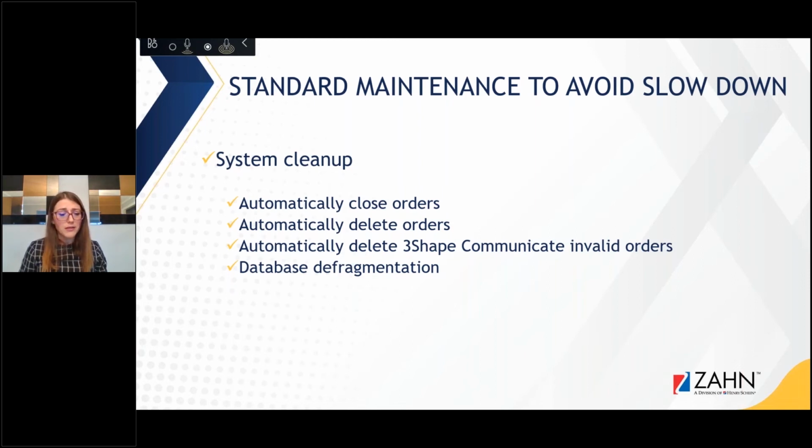Very important that when deleting the cases from 3Shape, especially if you're deleting manually, you move the files out of your 3Shape folder first. Otherwise, they will both be deleted, and unfortunately, it doesn't go in your bin, so you can't recover it anymore. So definitely move the cases first, and then delete. And I think this should be done as a monthly maintenance if you're doing this manually. But in Control Panel, now you have an option to automatically delete orders, and that will give you the option to delete the cases from your database, but not touch the cases out of 3Shape.